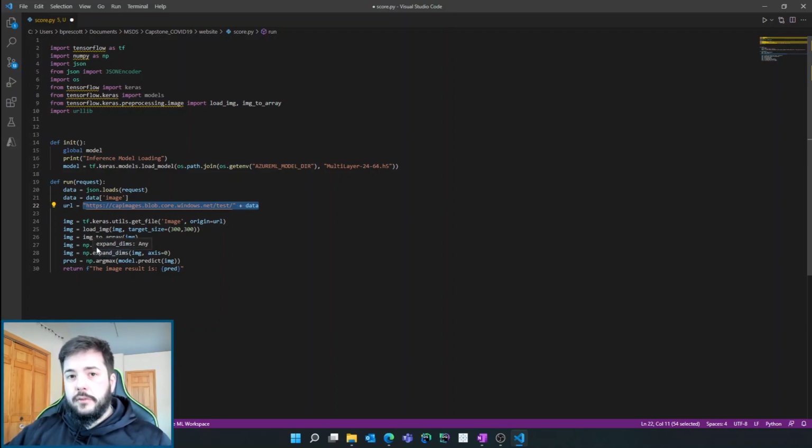So this is optional. You don't have to do this. What we're doing, and I'll show you the other side of this, is once the endpoint is deployed, the submission form will actually take an image from a local machine, upload it to this blob storage URL, and this scoring file references that blob URL and that file name to make sure it exists, so that we can also save the file for historic reasons in blob. So anyways, it's looking for that image in this URL here.